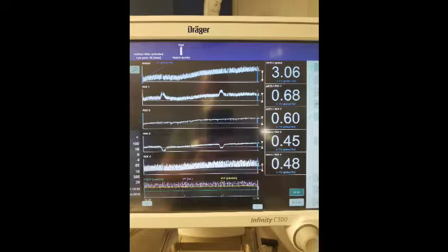Likewise, fluid, tissue, collapsed lung tissue also have different levels of impedance. While these vectors are flying around, gathering impedance information across these vectors, the tomography technology is able to create an image that represents the distribution of ventilation dynamically for each breath tidal volume.